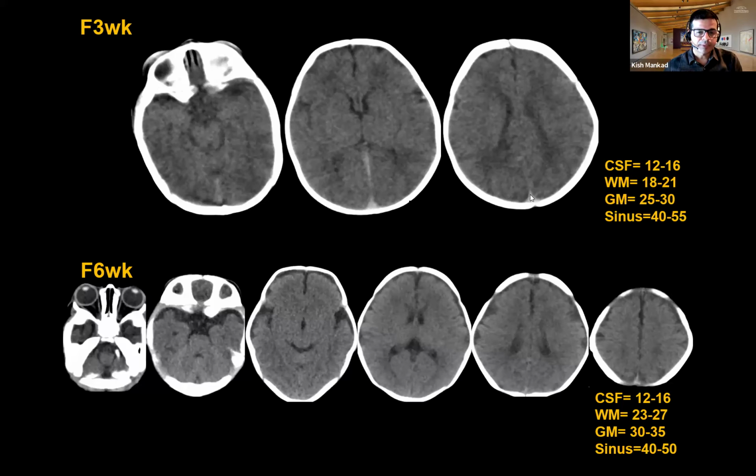But remember, this is not with contrast, okay? And the other thing is that the torcula there, the superior sagittal sinus confluence with it, is concave in its margins. If this was convex and swollen, that means it had a clot in it. Unless you get that configuration, you should not be worried in the very young.